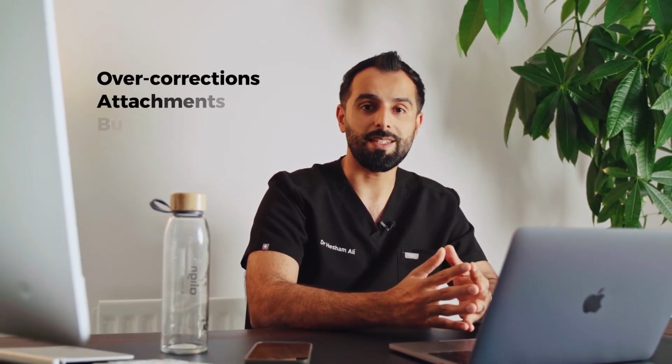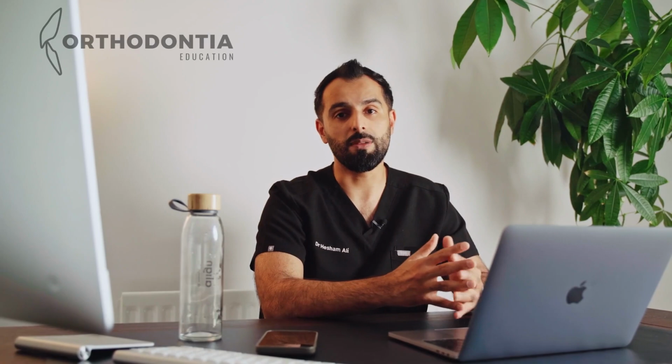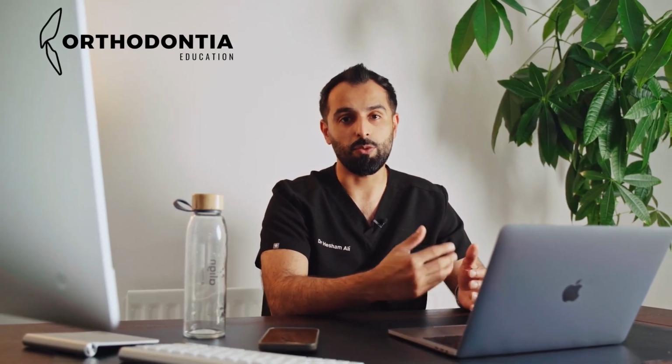Once I'm happy with that, I will then, in later reviews of my plan, look to harness and harmonize the overcorrections, the attachments, the buttons, and the staging. Right now, as I said, we're just looking to finalize the tooth positions, and the treatment delivery will be considered in more detail in subsequent reviews of that simulation.